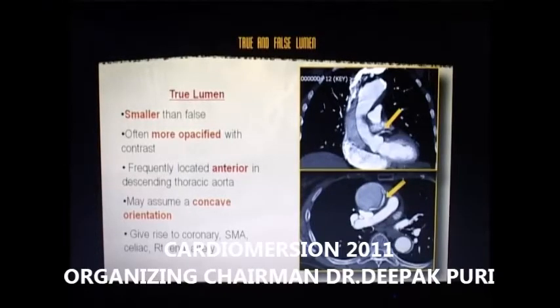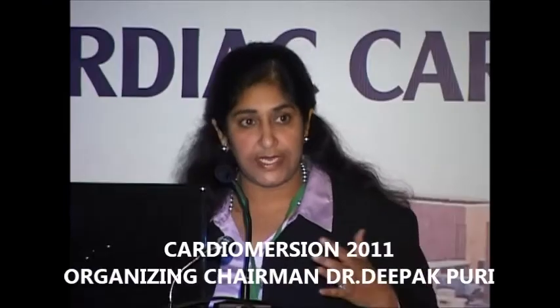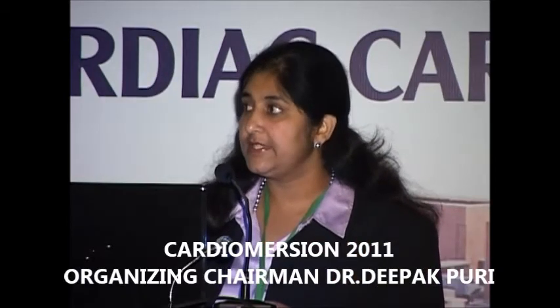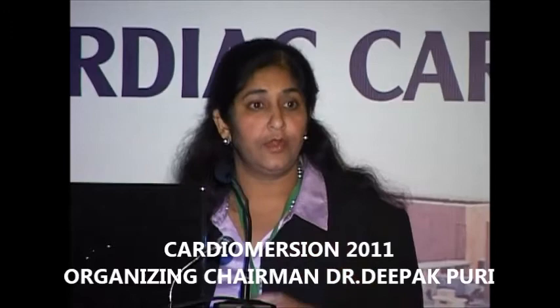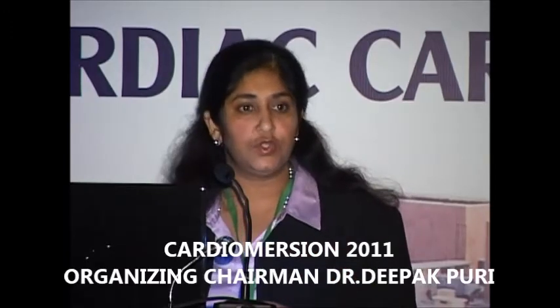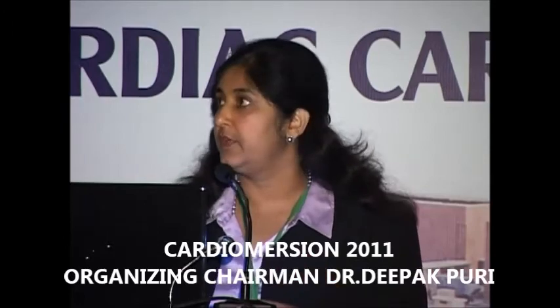As you can see over here, it has been reduced to a small concavity. And usually it is the more opacified lumen because that is directly communicating with the left ventricular outflow tract. Often it has been seen to be located anteriorly, although that is not the rule. And most of the times it gives rise to the coronary arteries, which is very important for us to be evaluating as well.